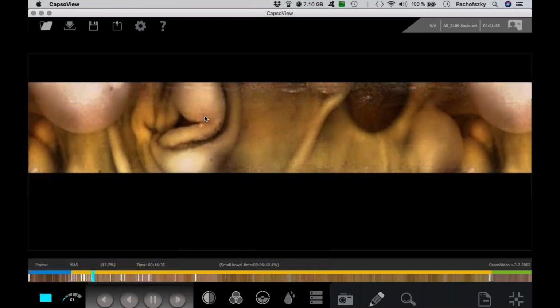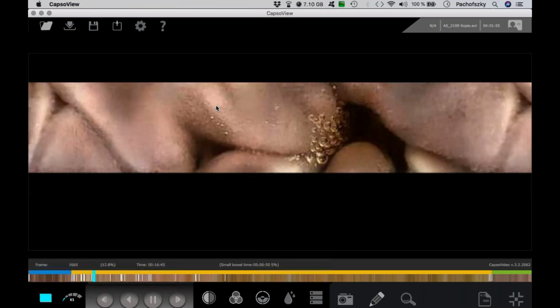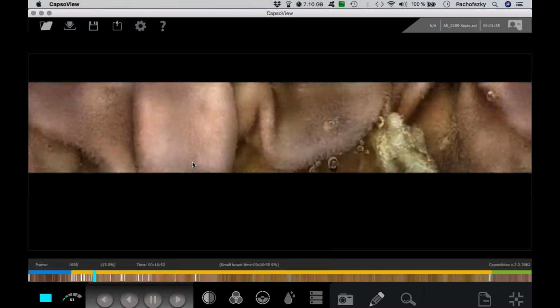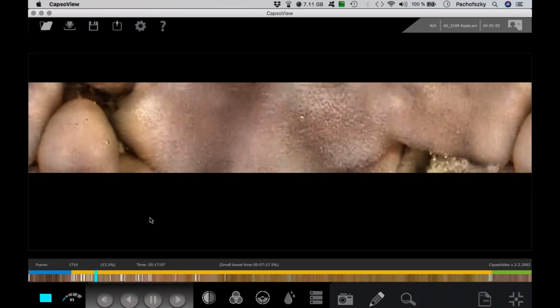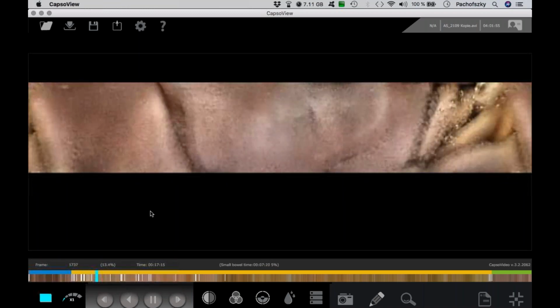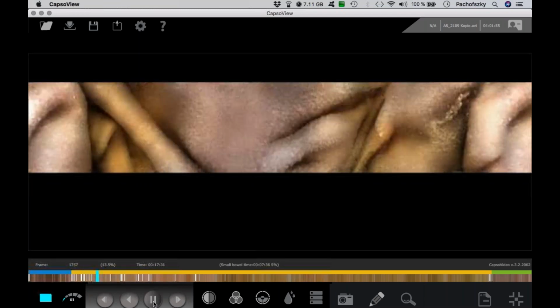Here you can see, or expect, it's looking a little bit yellow. And then I will stop when we come to the area where the pictures are changing. But we will go on for 1 or 2 minutes, I think.